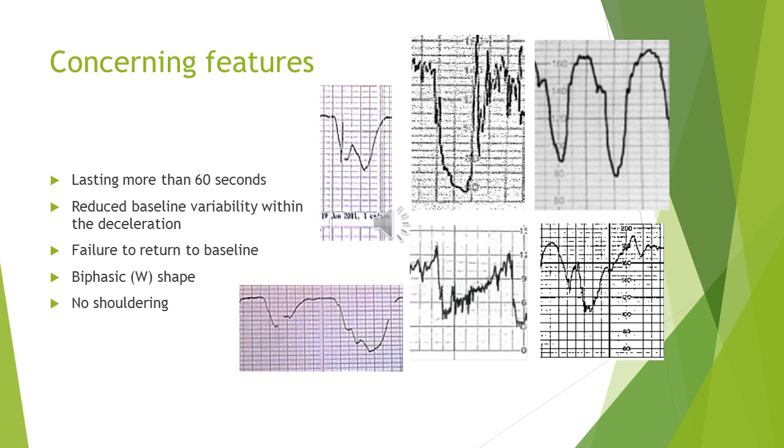But when I start to be concerned, if you have any of these 5 characteristics inside the V, you have to be concerned and you have to think about the management immediately. First, if it is more than 60 seconds. So if the drop in fetal heart rate lasts for a duration of more than 60 seconds, and you can see that in the second figure on the top.